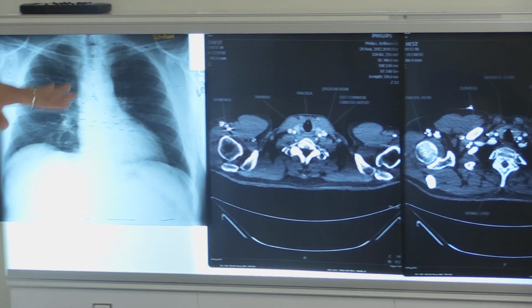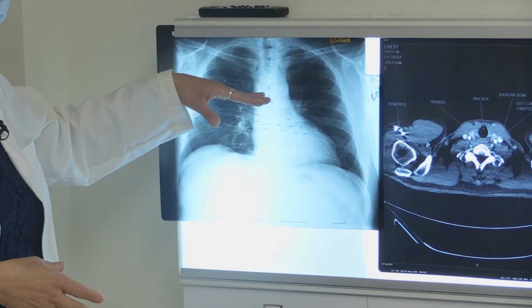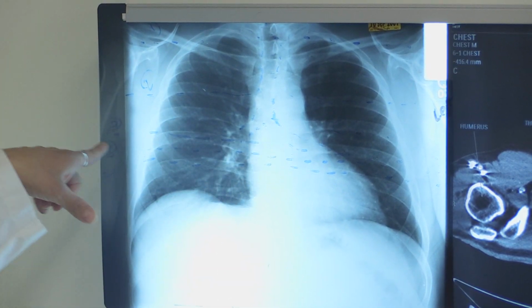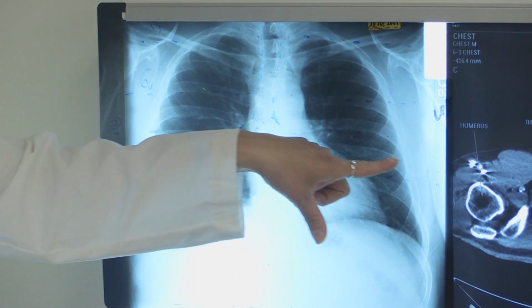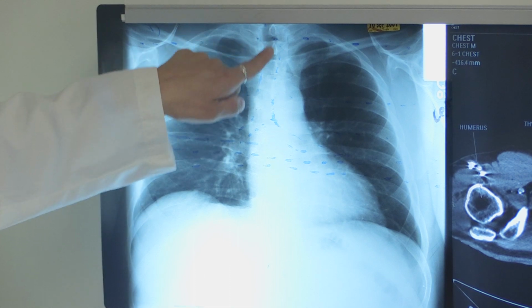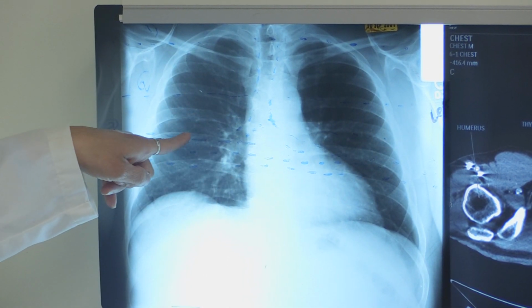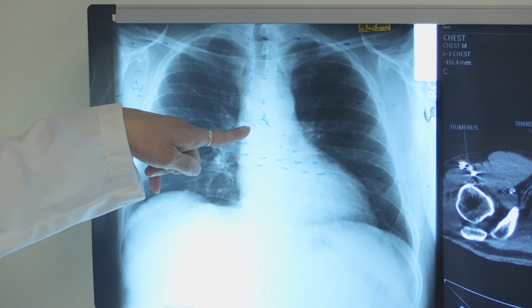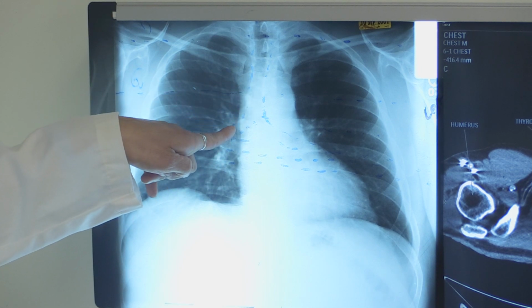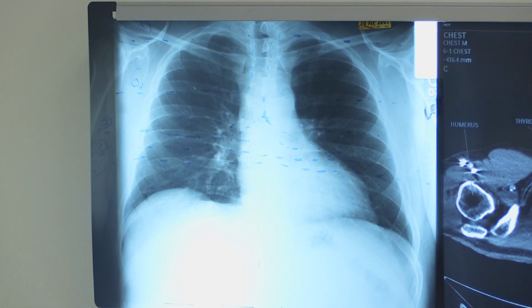Again, radiologists and technologists, when they're looking at CT images, are always looking at the scout just to verify that they're at the level that they think they are. And there are landmarks that can tell you where you are. For example, an image that shows the air-filled trachea will tell you what level you are. If you're looking at an image below the carina, you'll see the bifurcation of the trachea into the right and left bronchus, and I'll point those out as I move through my images.